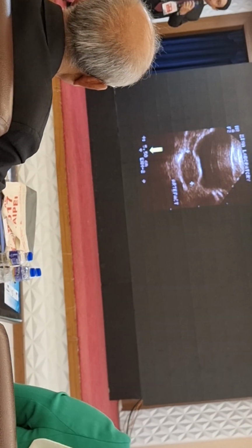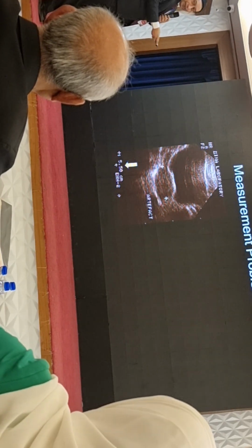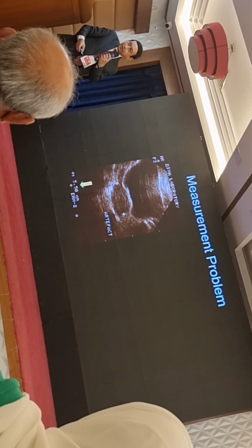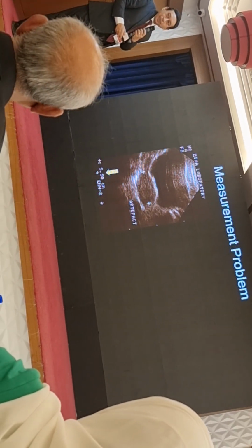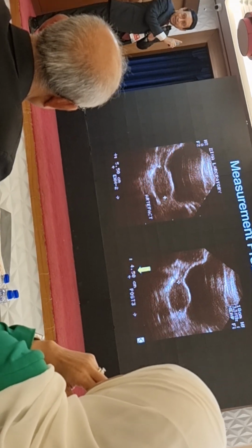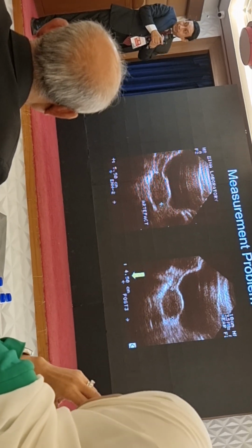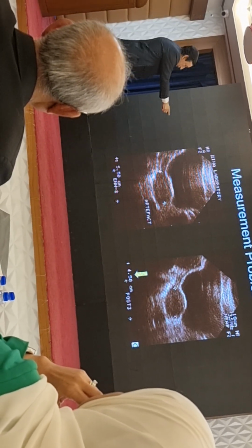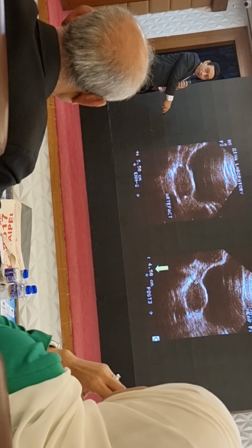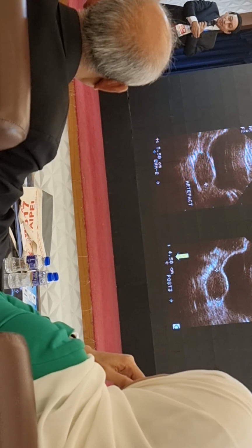And sometimes it is really problematic. Why? You can see here that this is a transverse section of the uterus, where the measurement is 5.5 centimeter. But actually this is not 5.5 centimeter. It is actually 4.5 centimeter. So it is very difficult, especially during folliculometry. If we are not cautious enough, then the measurement will be wrong. In this picture, actually there are 2 pictures overlapping one after another, so the measurement is more. This happened in prostate measurement also. So we should be cautious.